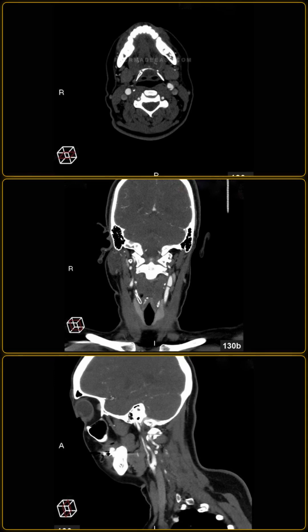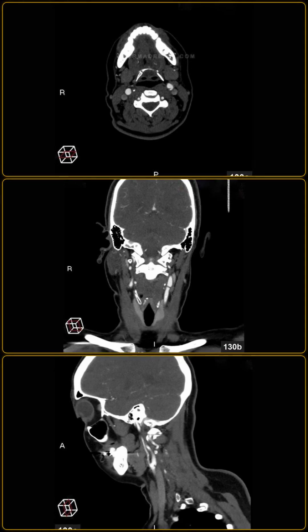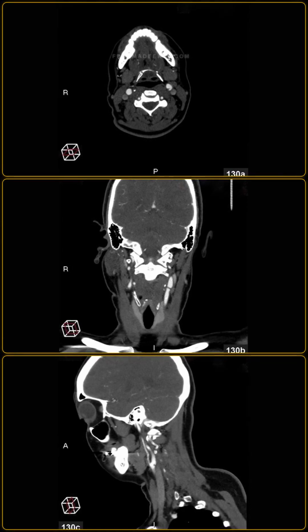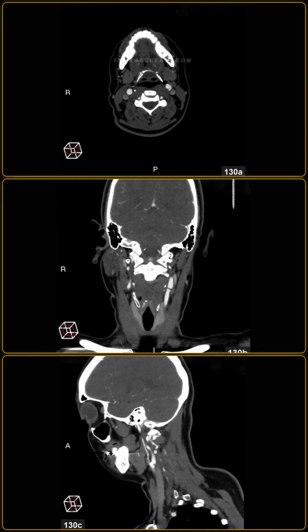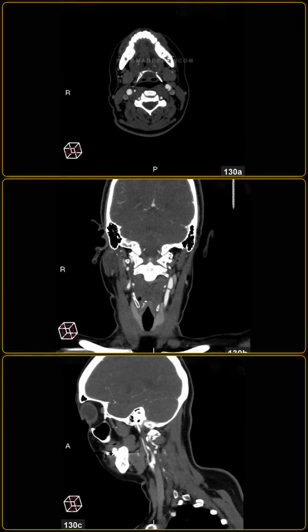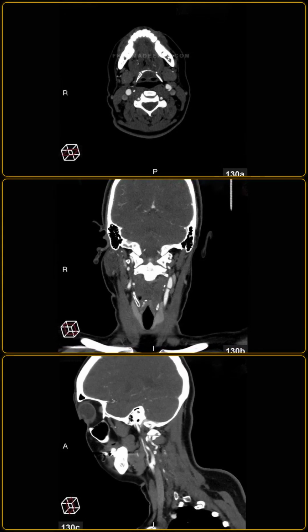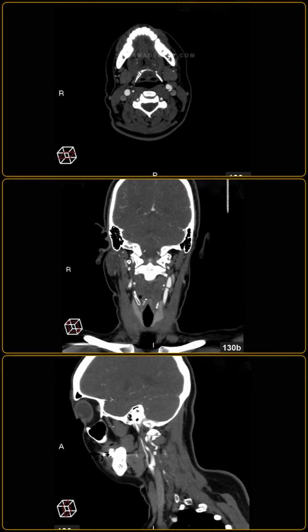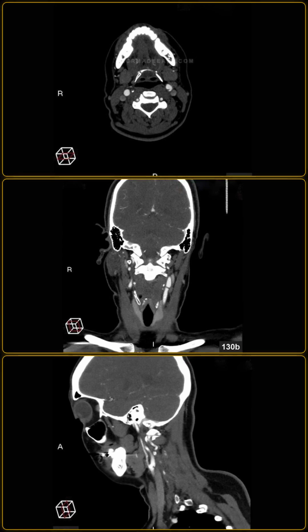What is the diagnosis, and what is the differential diagnosis for this carotid filling defect? The diagnosis is a left internal carotid artery web, which represents a rare but important etiology of ischemic stroke in young patients. The differential diagnosis includes a carotid artery dissection and a focal atherosclerotic plaque.